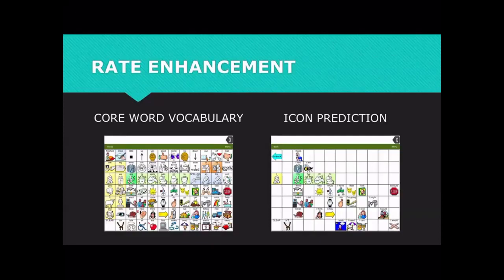And the core words, there's 82 core words on the first vocabulary. It's called 84 one-hit, and with that you get 82 options to speak, period. I can touch any button on the screen and it stays on that screen, and it doesn't go anywhere, with 2 exceptions. If you click on one of the buttons I'll show you later, it goes to mom and dad. You can add mom and dad into that. So that is the one hit.